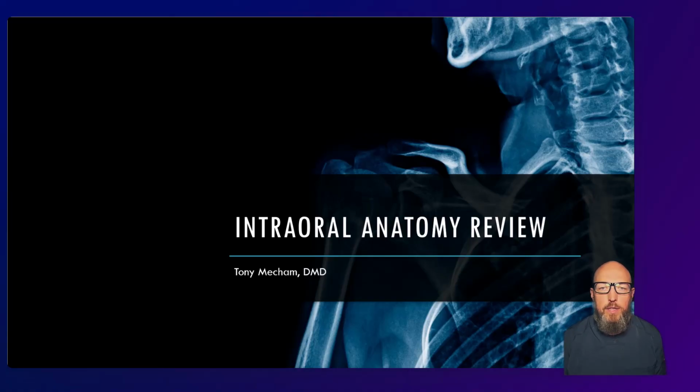now. And so in this three-part series, this first one is just going to cover some foundational concepts about how bone looks in radiographs. The second one is going to cover maxillary and mandibular structures on intraoral radiographs, and then the third one is a quick panoramic review.